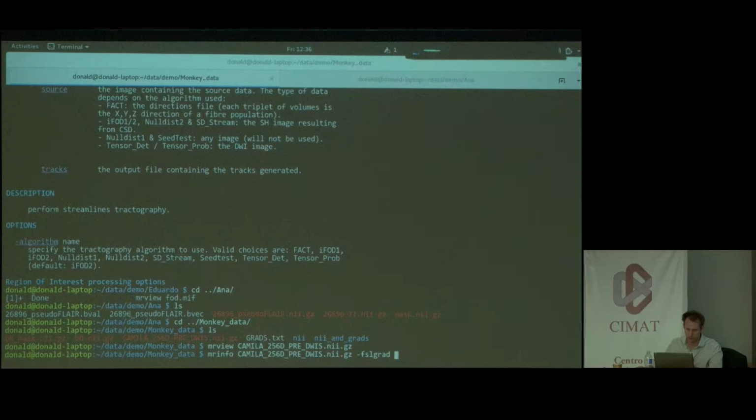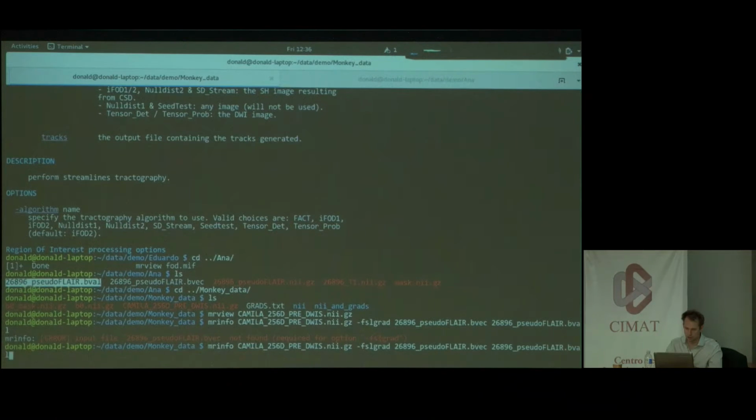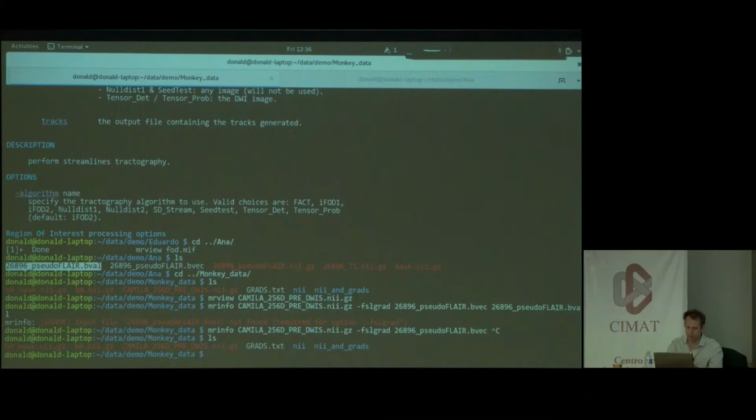So what I've got is the bvec and the bval. What happened here? Am I looking at the wrong place? Oh, sorry, yeah, okay.